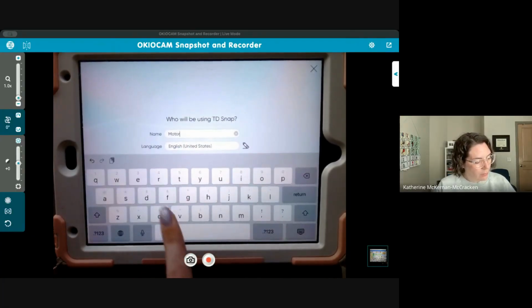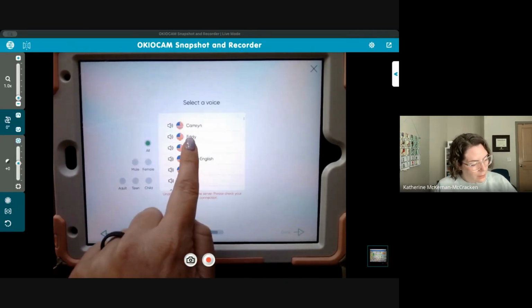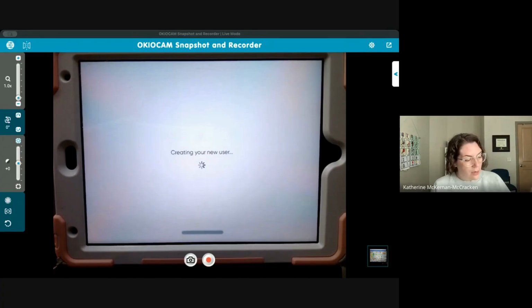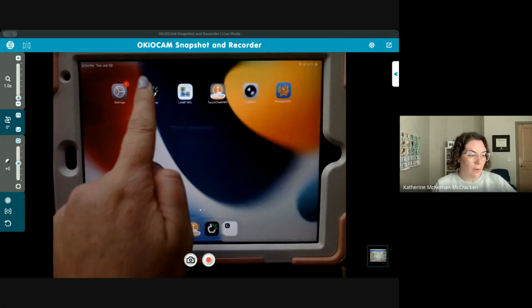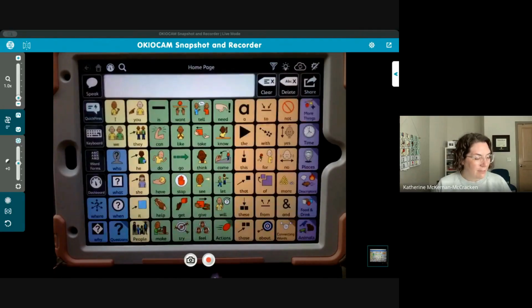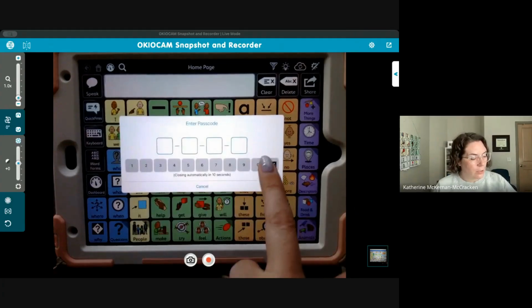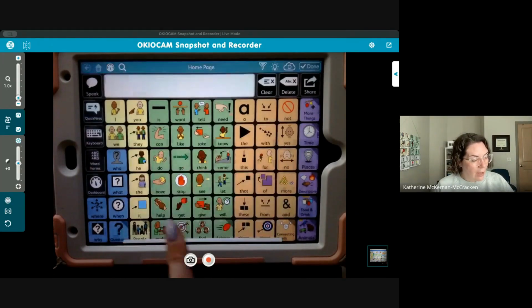I'm going to go to motor plan 30. Motor plan 30. And it's going to load it up. And then we'll be able to see the difference. Oh, except it quit on me. Hopefully it'll load and we should be able to see the difference between, this is 66 again. That's all right. Instead, let's switch over to core first and see what that looks like.